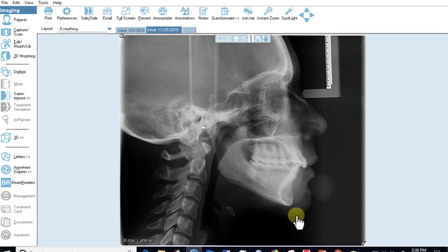Well, good. We're not going to cover the details of the cephalometric analysis here. We're just covering how to trace the X-ray. We're going to have a different seminar or course where we cover how to analyze the X-rays, and it's a little more involved than a few minutes of demonstration. So we are going to cover that separately. The purpose of this video is really to get you familiar with how to trace the Ceph and what analysis to look for.